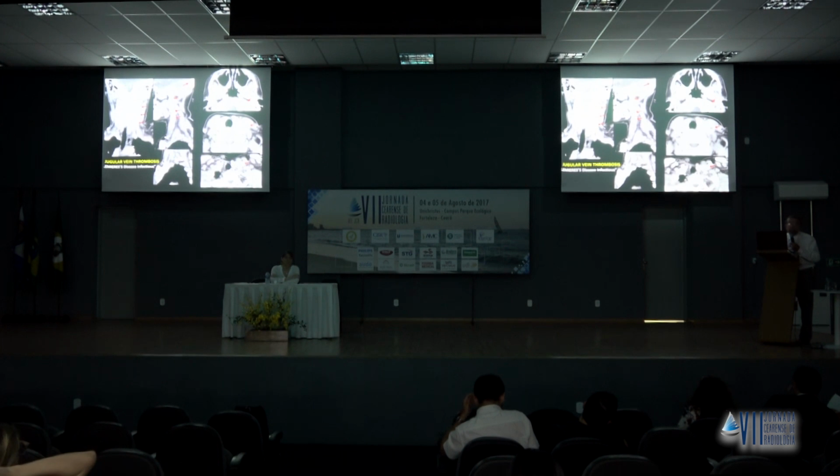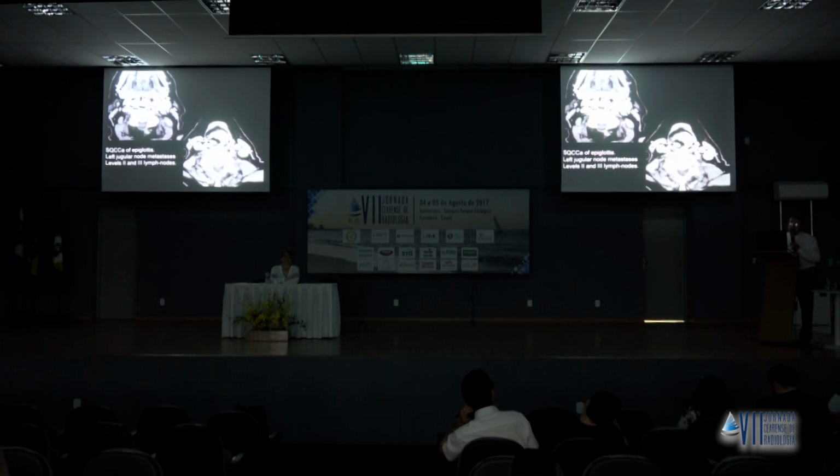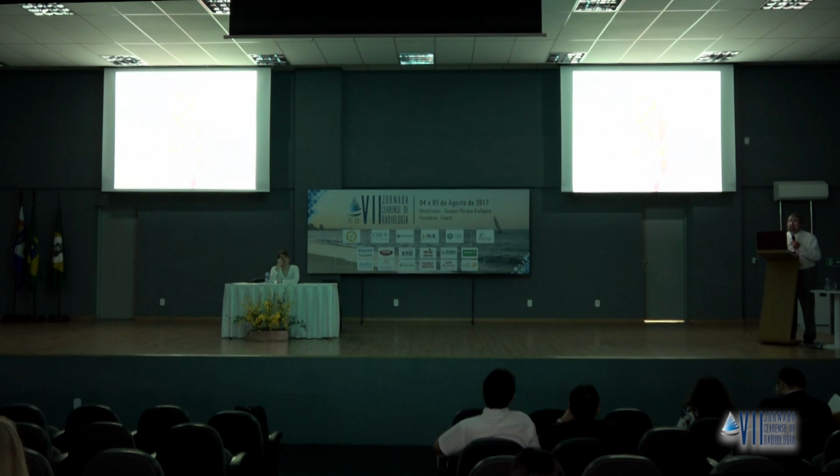Also, dissections are always a consideration. Also, you're going to see lymph node metastasis, in this case from a supraglottic laryngeal tumor. And these are the common things that happen in that space. So if you know the content of the space, you narrow your diagnosis very nicely. And most of the time, you'll be right in your diagnosis.